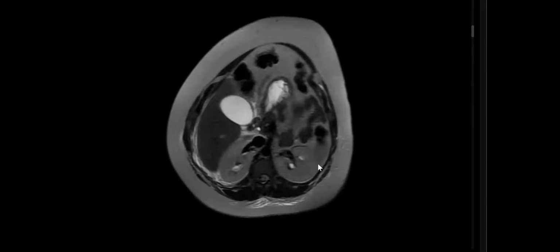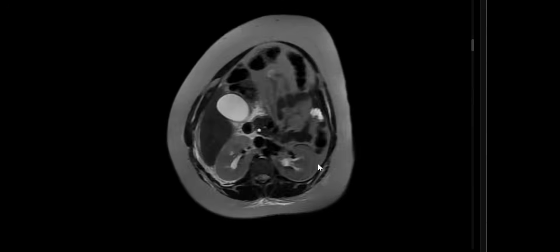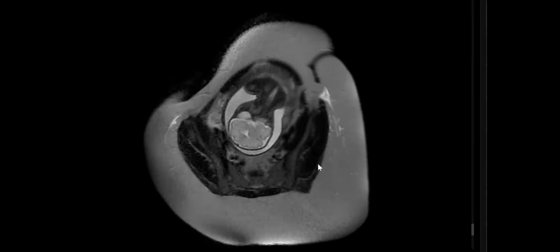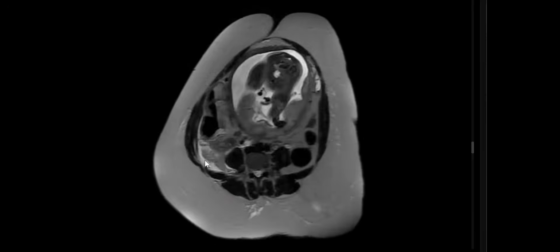Till now, nothing, but we have an important structure responsible for right-sided pain, usually right iliac fossa, but in case of pregnancy, it will be right upper quadrant. Okay, what is this structure, my friend?